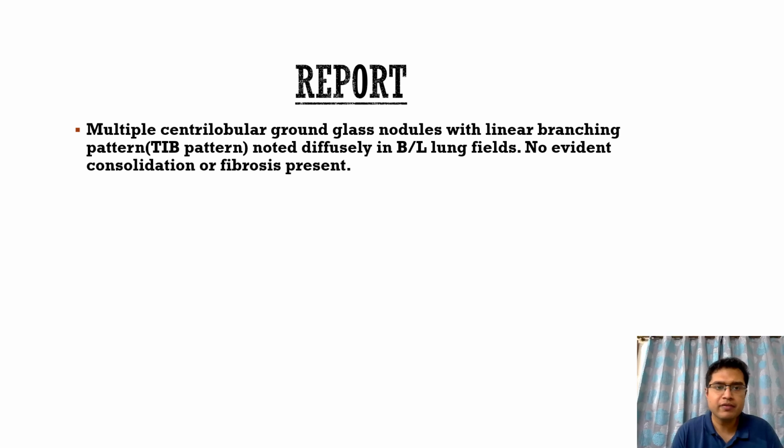This is the report that I had given: multiple centrilobular ground glass nodules with a linear branching pattern giving a tree-in-bud pattern were seen diffusely in bilateral lung fields, with no evident consolidation or fibrosis. Based on this particular finding, the diagnosis that came to mind was non-fibrotic hypersensitivity pneumonitis.